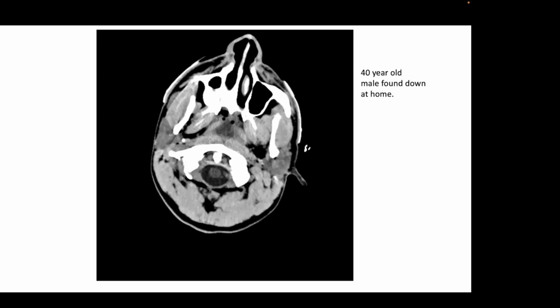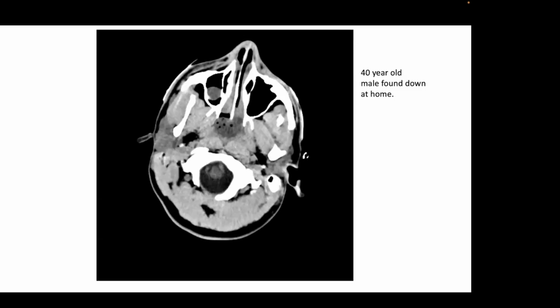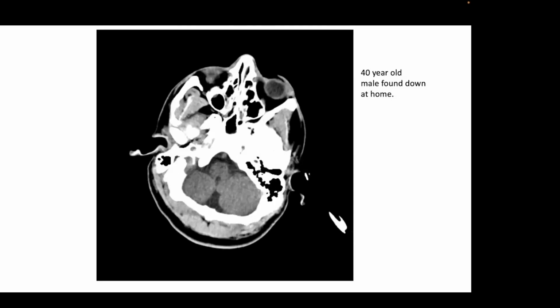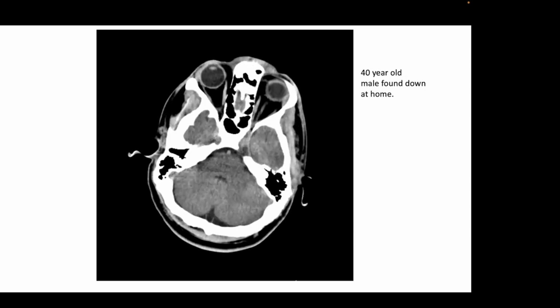Okay, now let's look at this scan. This is a 40-year-old patient. He was feeling nauseated in the morning and a little dizzy, and he decided not to go to work. His wife went to work, came back at lunchtime, and found him unconscious in bed. So this is the CT scan.